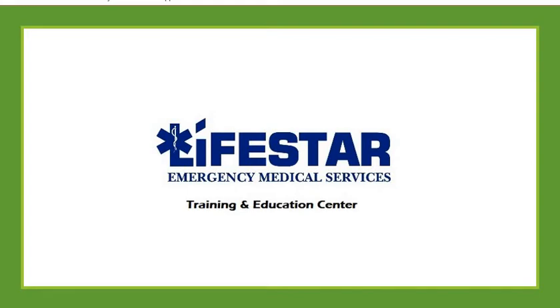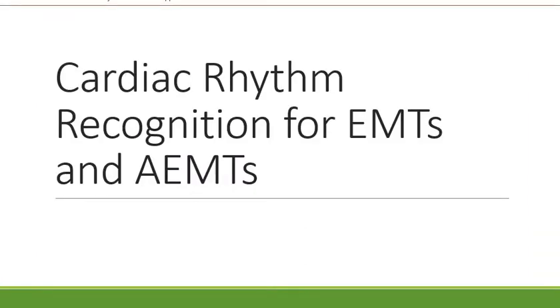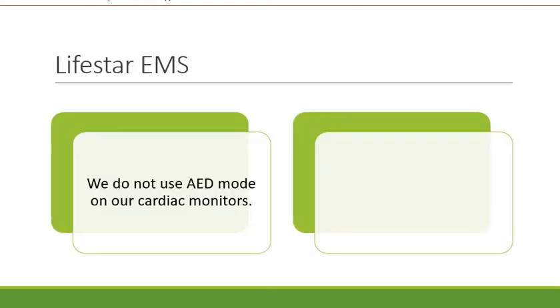Welcome to LifeStar Emergency Medical Services Training and Education Center presentation on cardiac rhythm recognition for EMTs and AEMTs. The reason we're providing this training for you is because at LifeStar EMS we do not use AED mode on our cardiac monitors. There are three reasons for that.